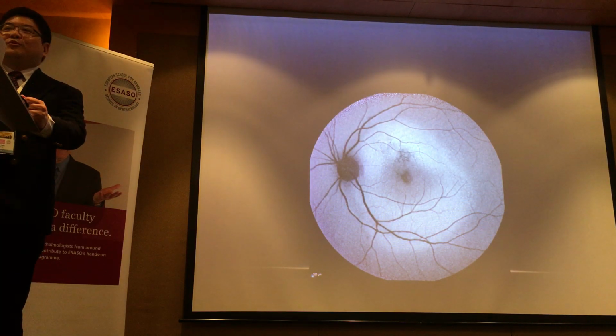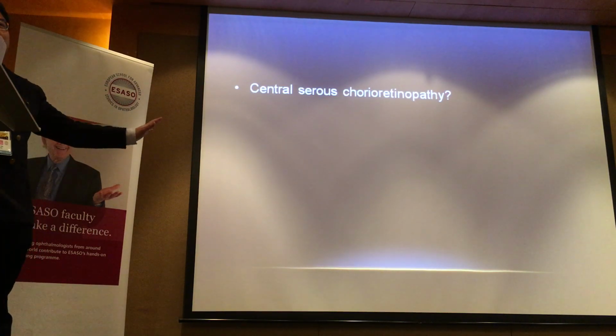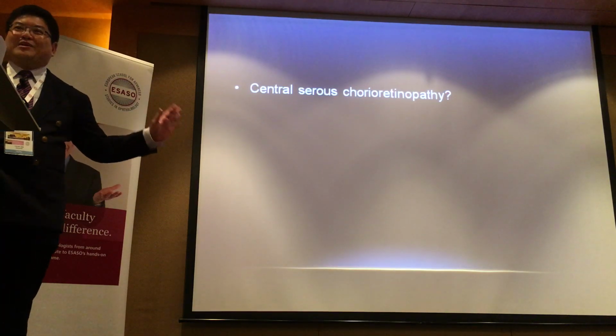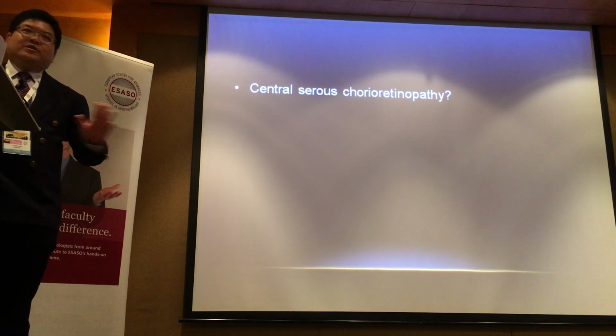I think some of you can probably shout out the diagnosis already. But is this CSCR? That was the question to me. If I had just seen this patient in my own clinic, I would have said CSCR, right? Of course, there were other features. Trust me, I'm just showing you examples. I'm not that cavalier with my diagnosis. But we looked through carefully, we examined the patient, there was no other indication.